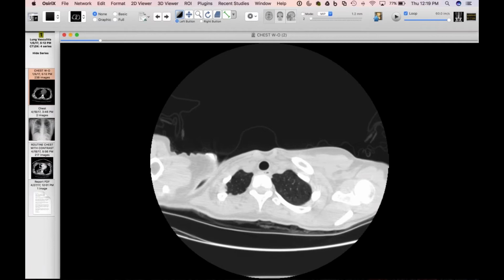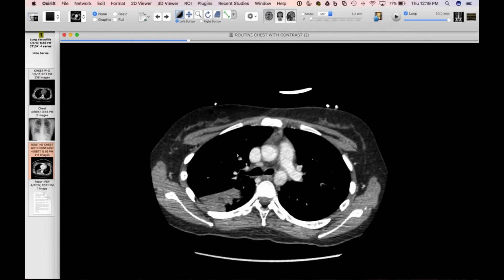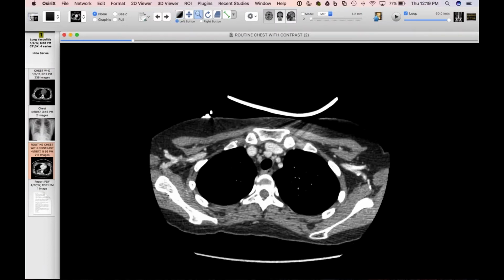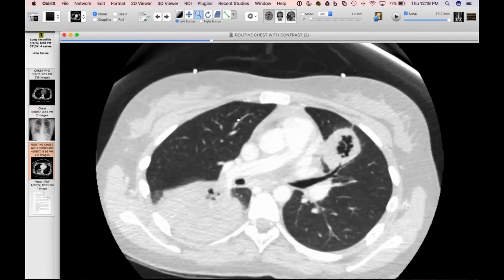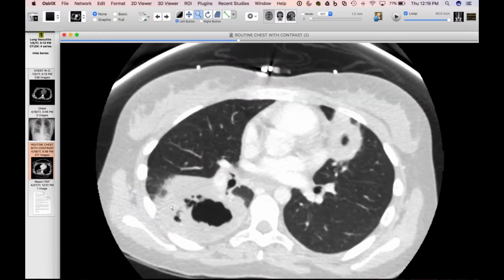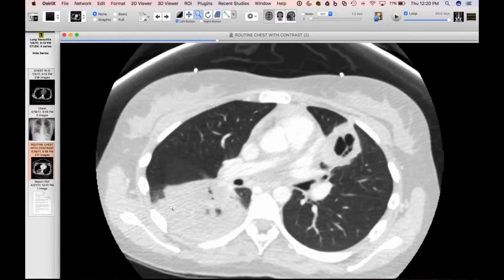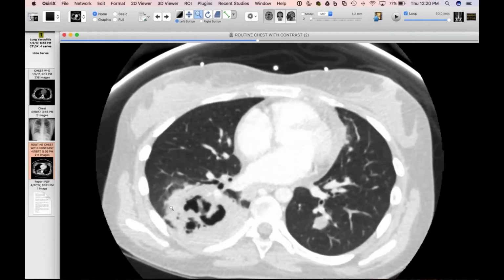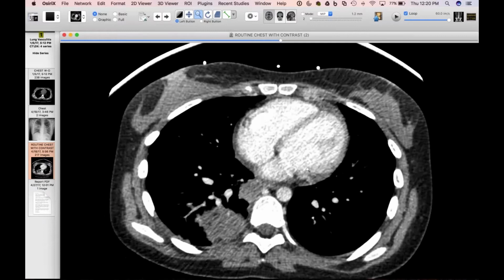But anyway, they started treating her with RIPE. And then she came in, got this radiograph and then the CT. And of course, everybody had looked at this. And when they brought this down and I reviewed it, you can see that she has these two large mass-like areas of consolidation, a little bit of surrounding ground glass, no satellite nodules. It doesn't really look great for TB, at least to me, especially because they never cultured anything.